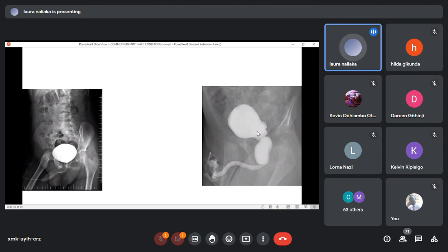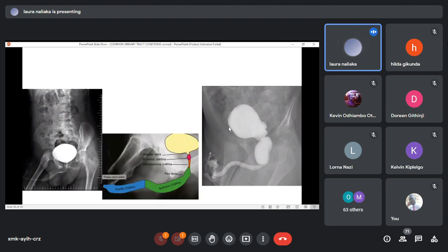This is a diagnostic finding in posterior urethral valve, and MCU is the only imaging modality that will pick this. You can see the bladder outline irregular because of the chronic obstruction, and a few diverticula starting to appear in a case of posterior urethral valves.